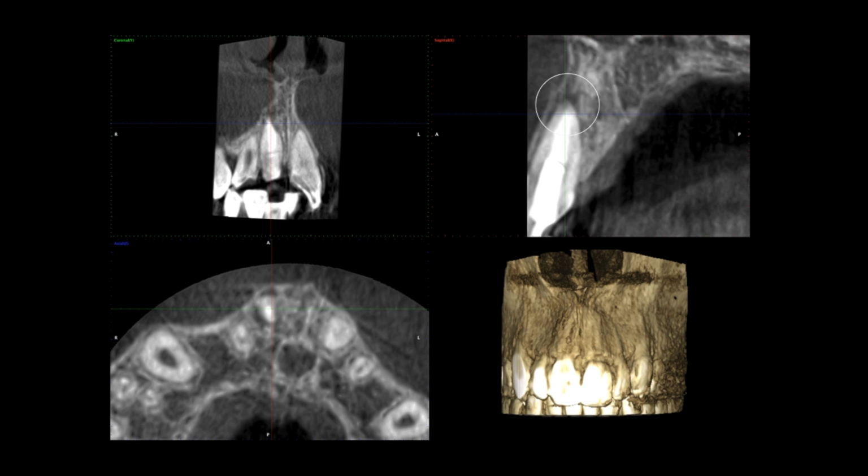In the case of trauma, the CBCT image gives far more information than can be gleaned from a radiograph, and in this case the review shows excellent healing in a way that you could not appreciate from the plain PA radiograph.